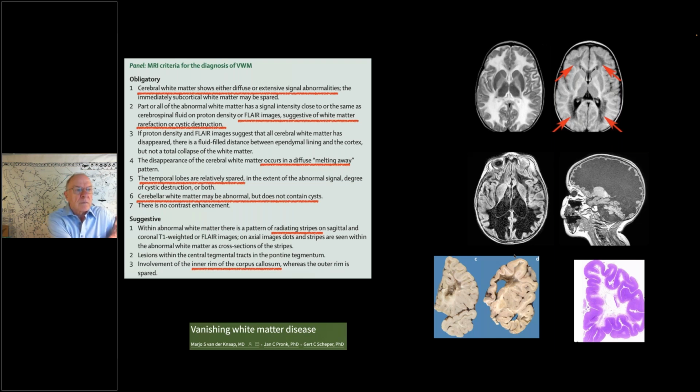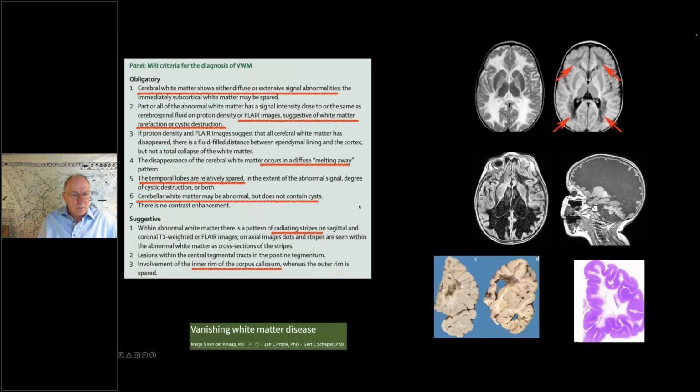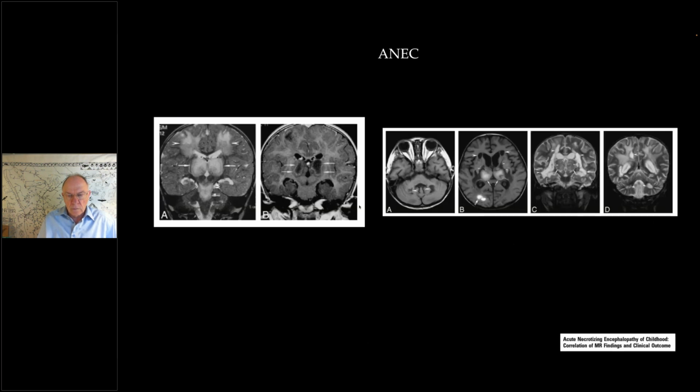The other possibility was mitochondrial leukodystrophy. Again, I don't think I have come across a case of hemorrhagic thalamus or thalamus with mineralization in mitochondrial disorder. So I think it is probably sequelae of demyelination of infective etiology rather than a progressive leukodystrophy. And at this point, I'll open the case for further discussion.